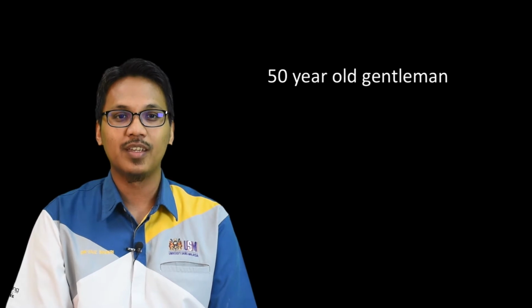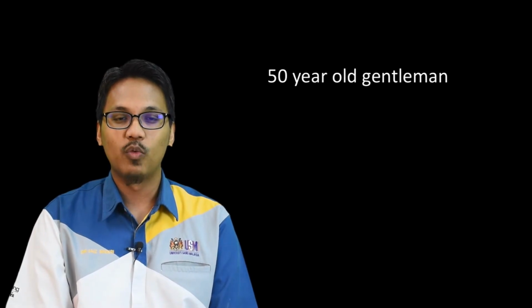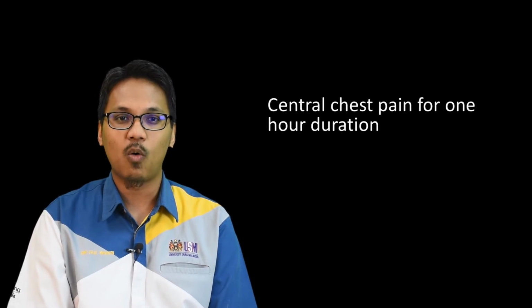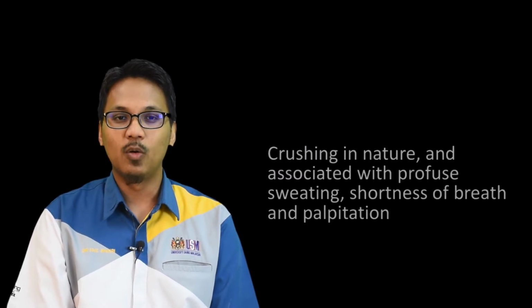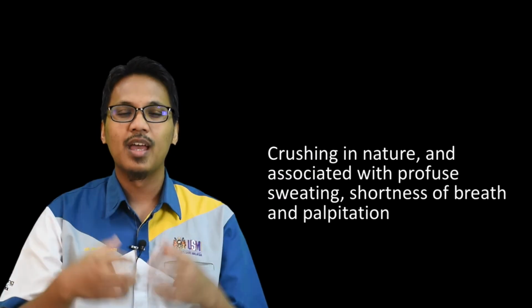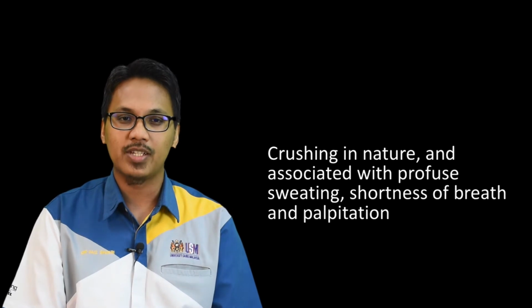Alright, so this is our case number 1. In this case, as you can see, this is a 50-year-old Malay gentleman with underlying ischemic heart disease, diabetes mellitus, as well as hypertension, presented to our emergency department with complaint of central chest pain for 1 hour duration. It was crushing in nature and associated with profuse sweating, SOB, and also palpitation.